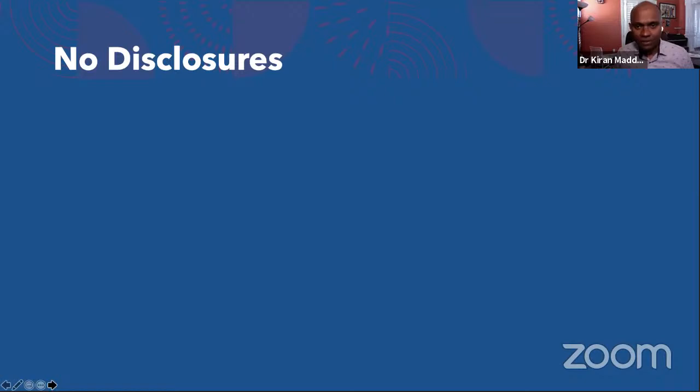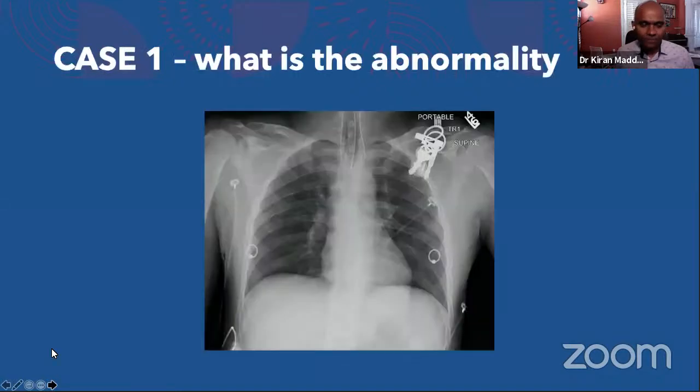So making yourself comfortable and confident about reading a chest X-ray, especially the portable chest X-ray, is not that easy. It takes some time and also some skill. But I'll try to do my best. You can see some of the radiographs I show you may have the word portable, supine. That's what I want the medical students to understand when looking at a chest radiograph.